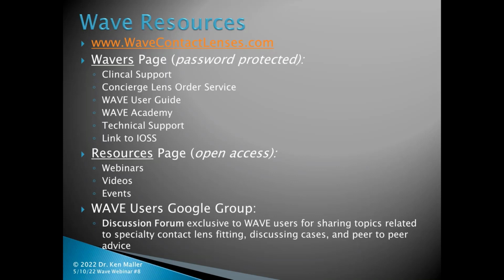Definitely, if you're newer to wave, you really want to start by getting the screen to at least represent as close to reality as possible what's truly going on with that cornea, so that you can design a lens and make certain that your design choices make good coherent sense, given that it's a very good representation of the cornea inside wave. Absolutely. That's definitely probably more complex than a lot of people will get into just starting out, but still good advice as people get more experience fitting corneal GPs.